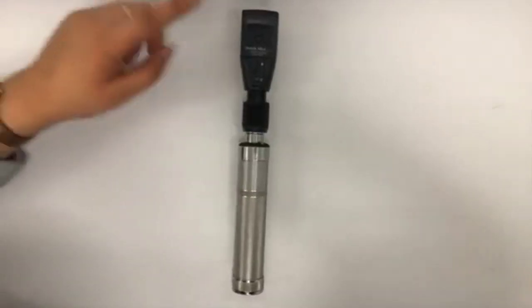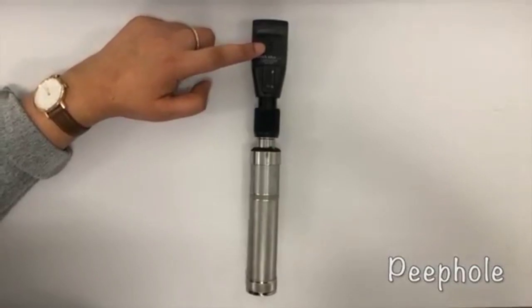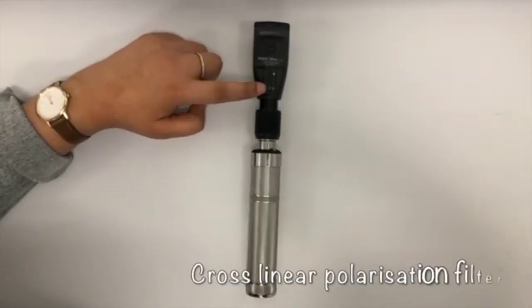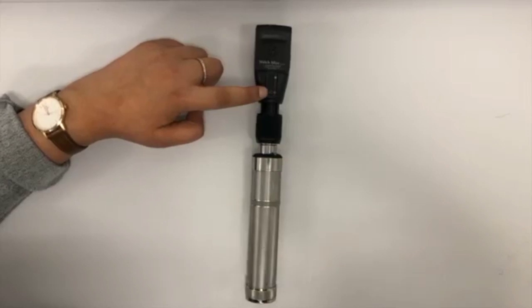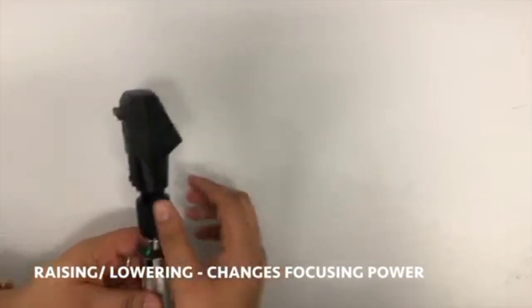The other parts of the retinoscope include the forehead rest, the peephole, which the examiner looks through, the cross-linear polarization filter, which needs to be down during testing, and the focusing sleeve. Raising or lowering the sleeve changes the focusing power of the beam, while turning the sleeve rotates the reflection.